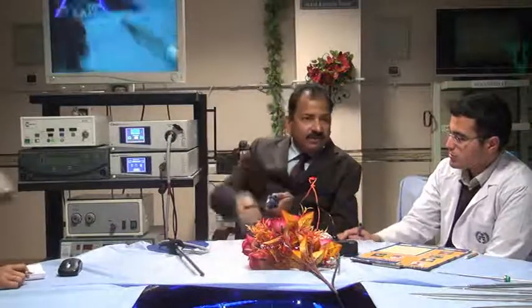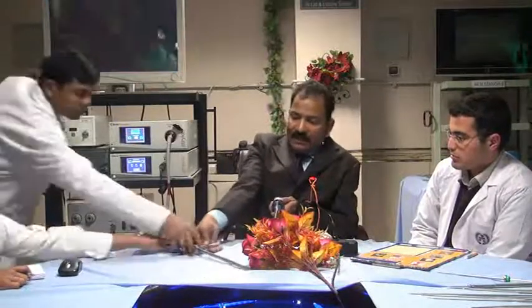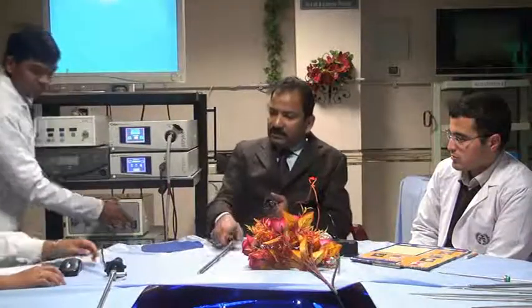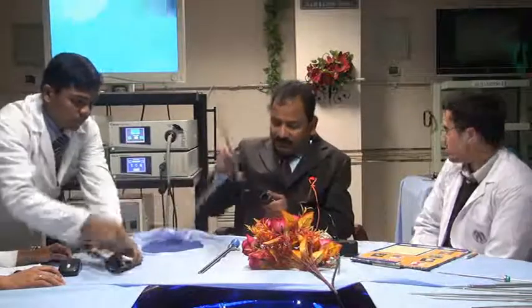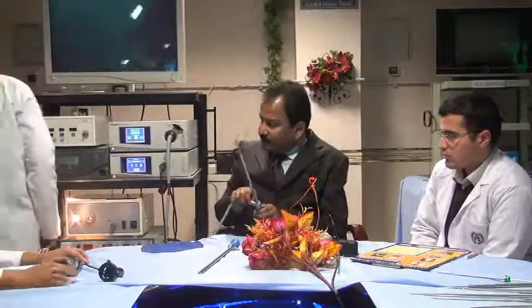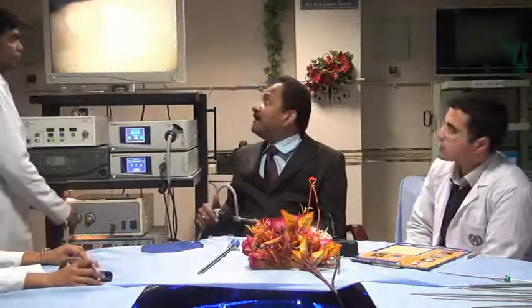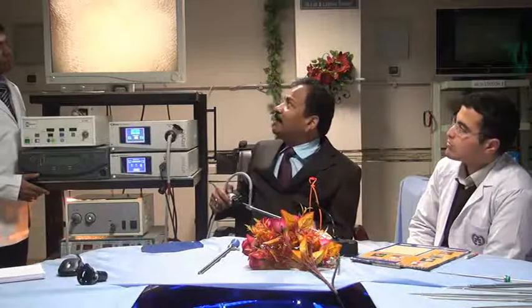I will show you. I will change this light source. I am attaching halogen. Here is a halogen. And I will attach the halogen light. The telescope is very good, because this telescope has an adapter for that light, so I am attaching this. And here this is the halogen light. And see here, what happens? The quality of light changes. What is this? This is impurity, isn't it? Now this camera will remove that impurity.